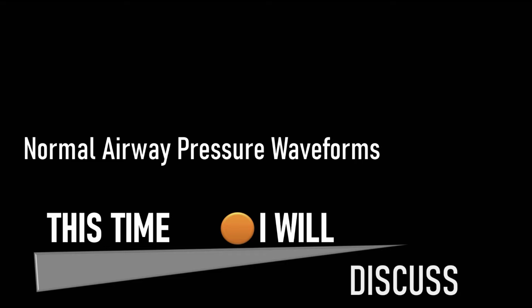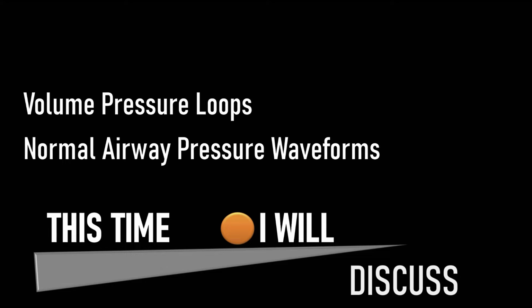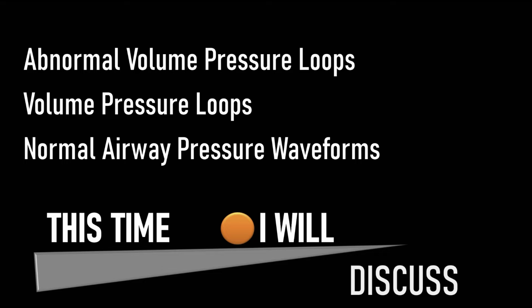This time we're going to look initially at normal airway pressure waveforms. I'm then going to start discussing dynamic volume pressure loops, and I'm going to show you some abnormal volume pressure loops. At the very end I will mention static volume pressure loops.